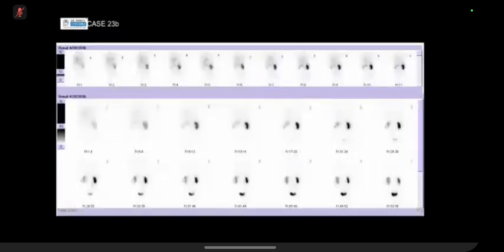Okay, so you keep saying contrast, but just to be pedantic, for nuclear medicine it's tracer uptake or radioisotope. It's not contrast. So just be mindful of that in the exam when you're presenting nuclear medicine studies. You can say tracer uptake, but not contrast.